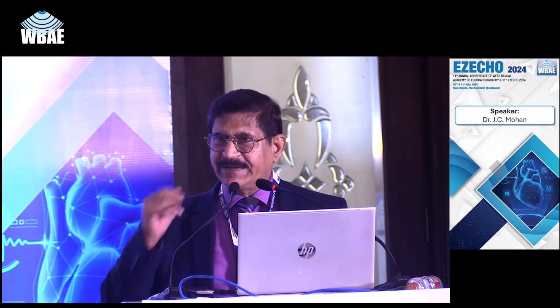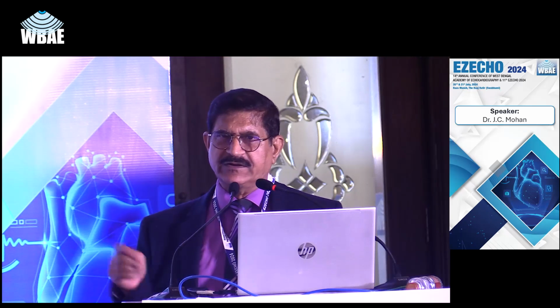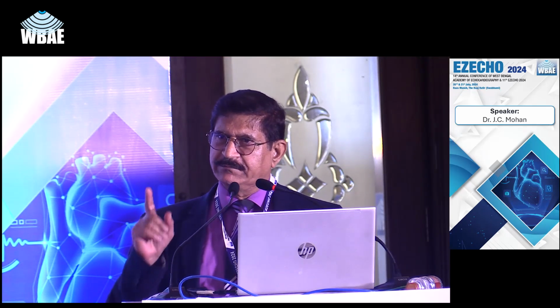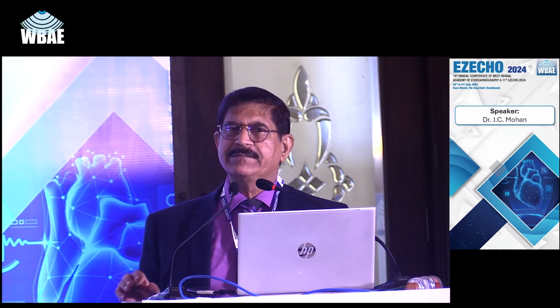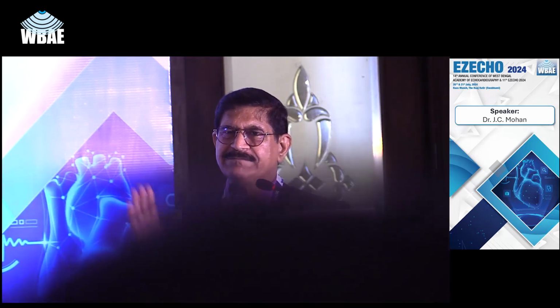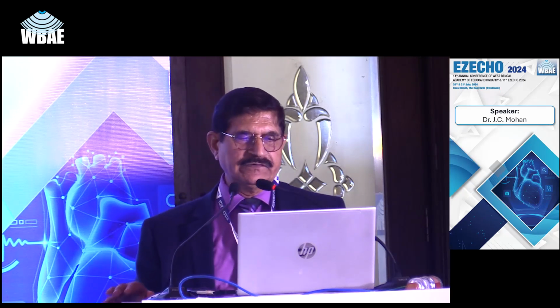Okay, there is pericardial effusion present. Conventionally, whenever there is pericardial effusion with hypertrophic cardiomyopathy, cardiac amyloidosis should become the first diagnosis. However, pericardial effusion does occur in hypertrophic cardiomyopathy. Various series have shown 4 to 10% of cases of hypertrophic cardiomyopathy have pericardial effusion.